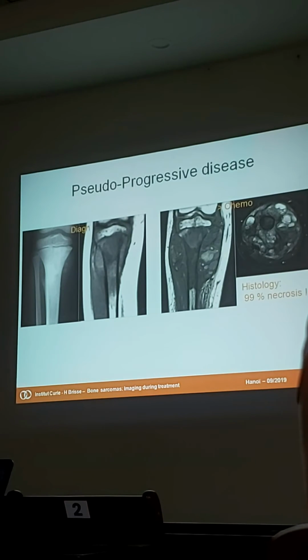This is just another example of the same situation. Diagnosis, small soft tissue invasion. After treatment, increase in volume, but all necrosis with fluid levels, all this was completely necrotic.